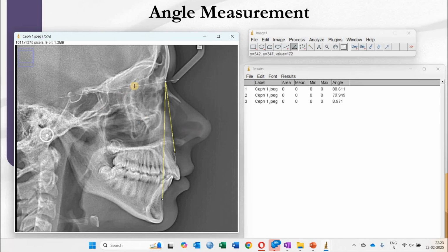I hope you understood how angle measurements are done. Feel free to practice the MCQs that follow and practice measurements of angles and use it in your routine applications.